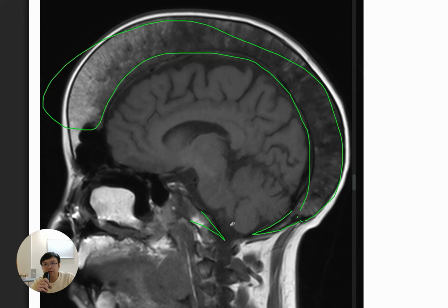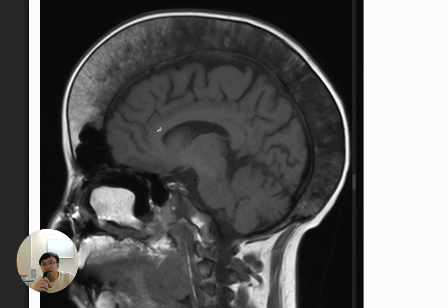These two parts, as we have also mentioned previously, have relatively little red marrow. Here we are not converting the fat into hematopoietic cells, we just make them hyperplastic. So if they have little red marrow originally, even if they are hyperplastic, they won't have much significant bone marrow expansion. So this is a very important clue and also a very classic sign, which supports that all those diffuse bone marrow changes are actually responding to chronic anemia.